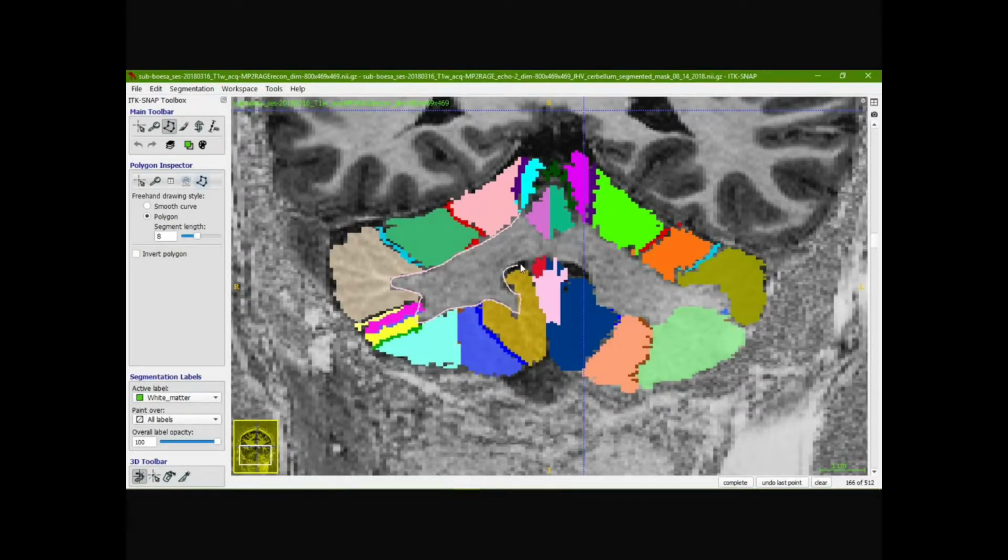you do the outline, right? And then let's say up to this point, just the right side. So you click enter, and that is going to do the segmentation just for that part that you were working on.